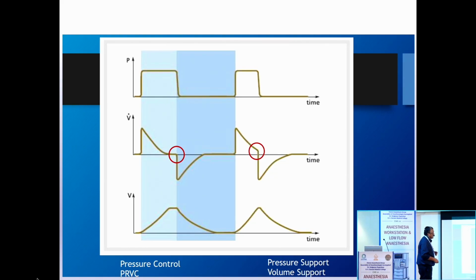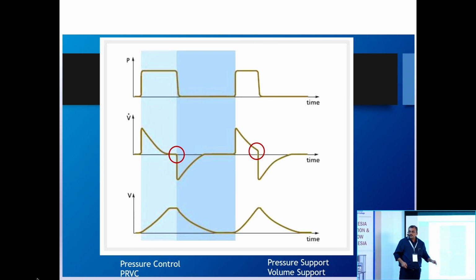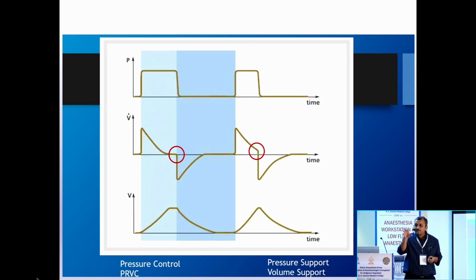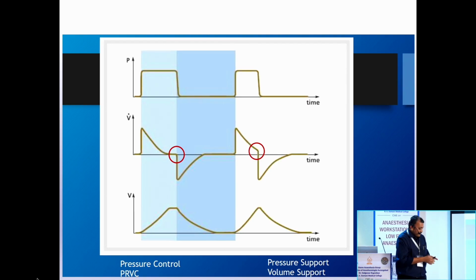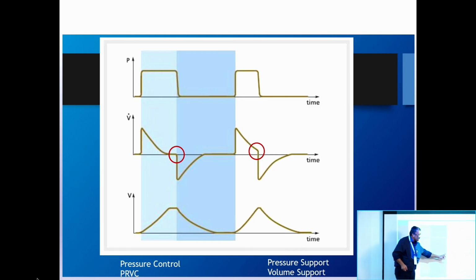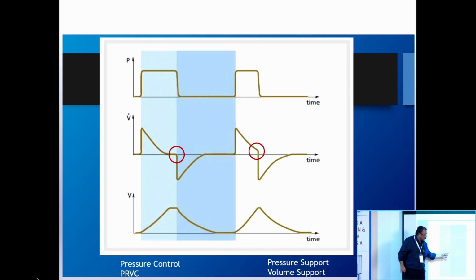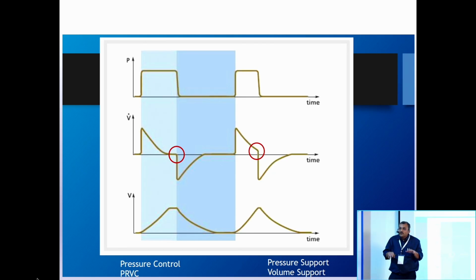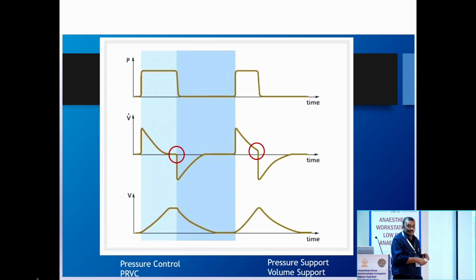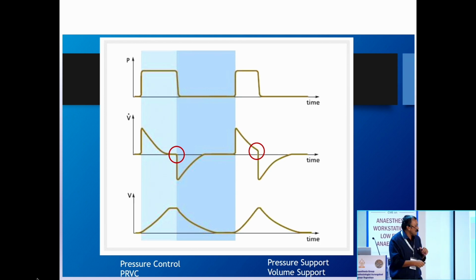Inspiratory time and expiratory time, how much you are setting. This is an inspiratory pause. Okay. So your inspiratory pause is a good thing. When you do an inspiratory pause, it helps the diffusion for oxygenation. But suppose with this inspiratory pause you are having a nice expiratory pause, it is touching the baseline, all good. But if it was causing an auto PEEP, you need to consider whether you can cut down on your inspiratory time. So this is something you will only be able to understand if you see the graphs. It is something which you won't be able to see from the IE ratio numbers, okay?